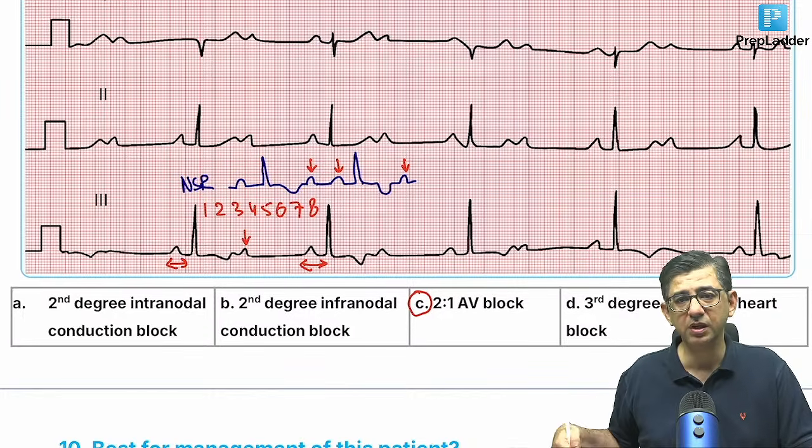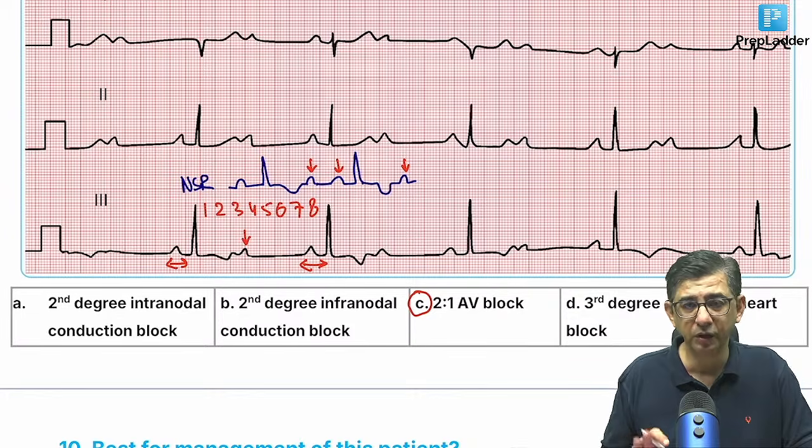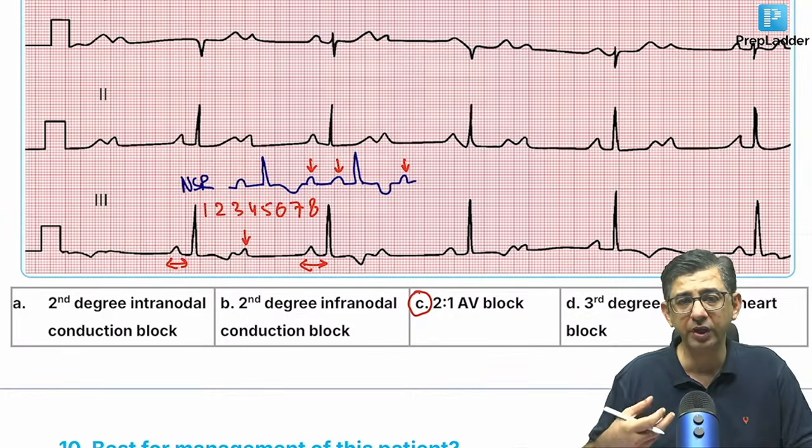तो उसका भी ECG आगे दिखाता हूँ आपको जिसमें 3rd डिग्री हार्ट ब्लॉक होता है. लेकिन अभी के लिए मैसेज है कि कभी भी अगर ब्रेडिकार्डिया वाला क्वेश्चन आता है, तो ब्रेडिकार्डिया वाले क्वेश्चन में करना क्या है कि पहले तो देखना है कि मोबिट्स 1 है कि नहीं. मोबिट्स 1 में क्या होता है, देयर इज अ प्रोलॉन्गेशन ऑफ द पी आर इंटरवल.